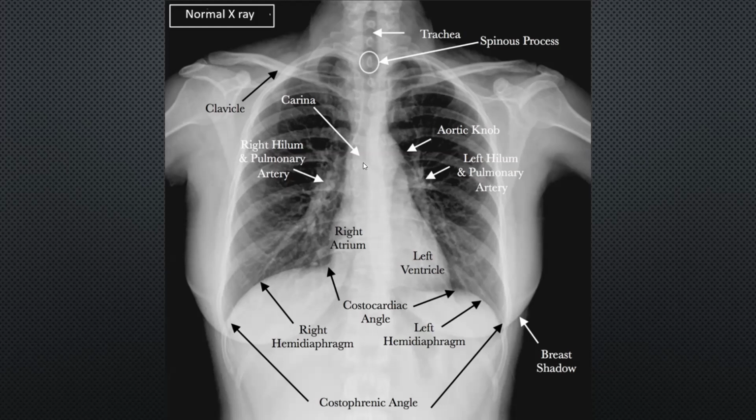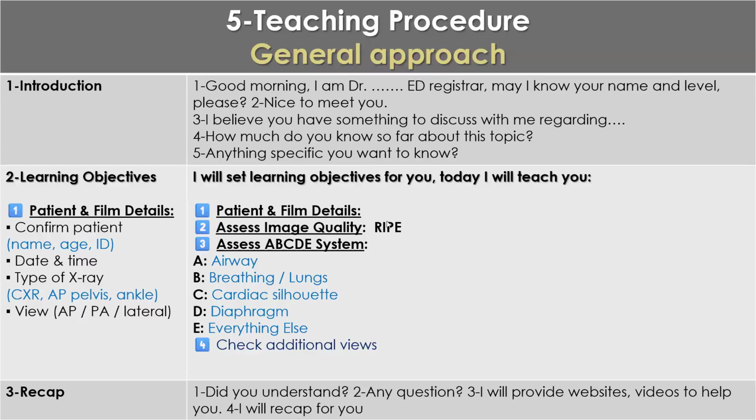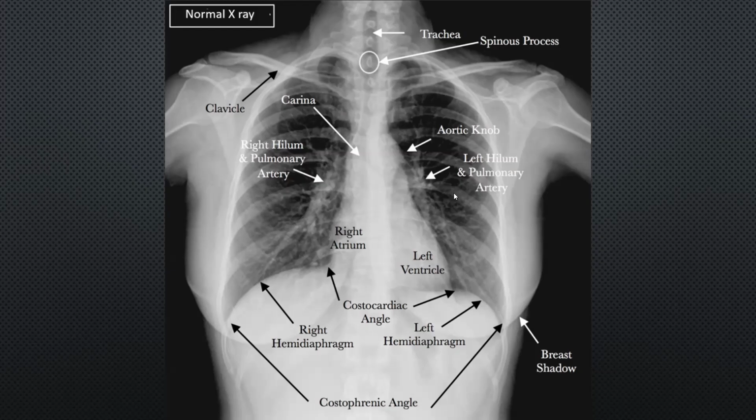So this patient is centralized, right? And I, inspiration. At least how many ribs should be clear? 6. So you can count in the exam. 1, 2, 3, 4, 5, 6, 7, 8. So more than 6. So this is inspiration. Easy.